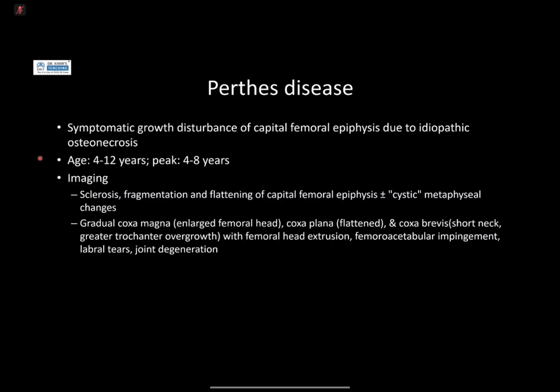Or is it fragmentation of the trabecular bone? Is it some deposition of fibrofatty tissue or granulation tissue because of the altered blood flow within the hip joint? The cool thing is these are actually not very rare, and in the literature it's reported that they are seen in a delayed phase of Perthes disease. So it could help you to be quite confident that this is Perthes disease. But of course, take it with a pinch of salt, and always correlate with the clinical history.